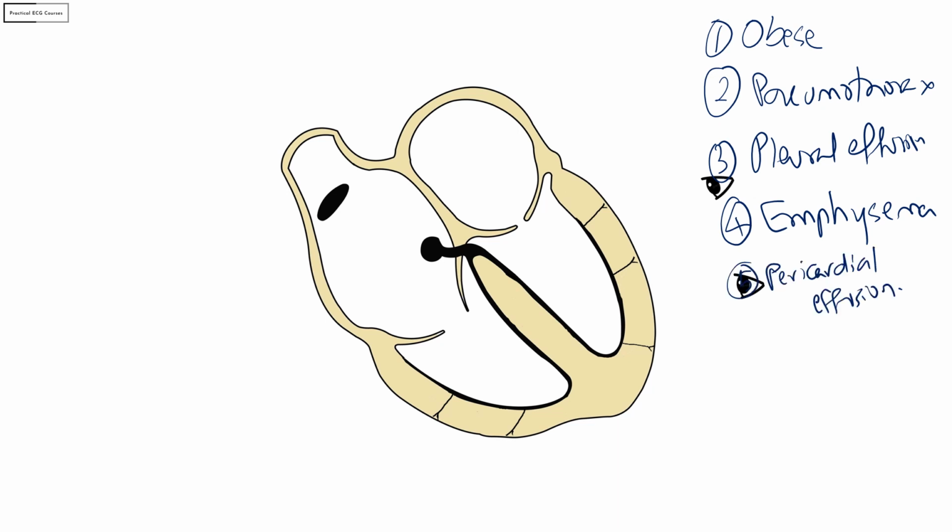So these are all causes outside the myocardium which decrease the voltages by dampening the signals coming from the heart. Now that we have reached the myocardium proper, suppose a patient has had an MI and this area is completely infarcted. What happens to the vectors there? The infarcted area cannot transmit any impulses, so therefore there are no vectors there. So what happens to the size of the vector there? It is actually smaller compared to the other side. So myocardial infarction is another cause of low voltages.